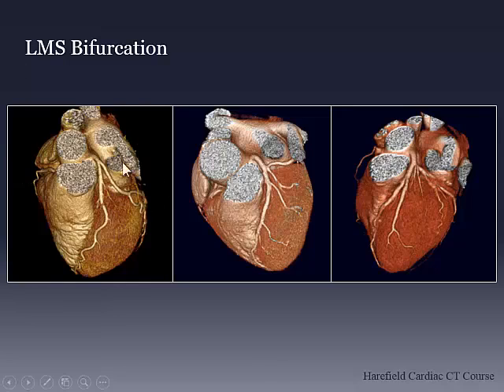But you should always use the volume rendered images for giving yourself the 3D anatomy. Where the volume rendered is very helpful is not for identifying stenoses, but to give yourself the 3D orientation. It's extremely helpful in coronary anomalies, because you'll often understand the courses much better when you look at the volume rendered. The difficulty is if the coronary vessels run in myocardium, then the volume rendering won't work very well. But this is great because all your surgical colleagues love these sorts of images.